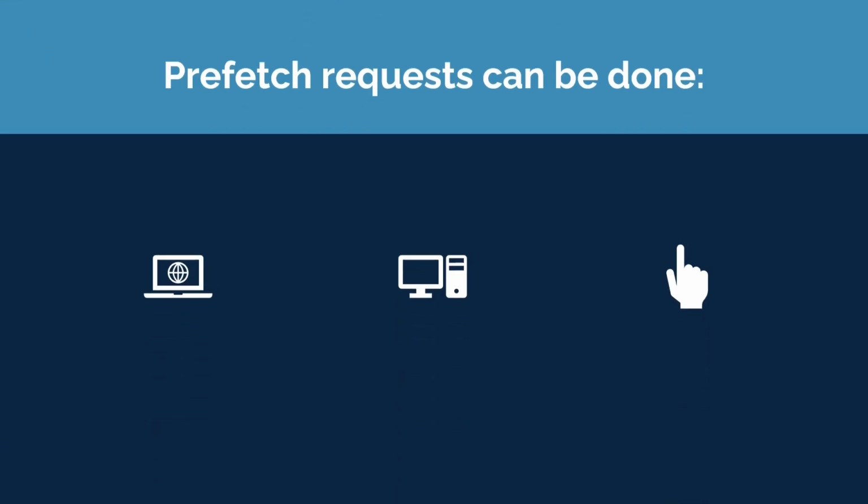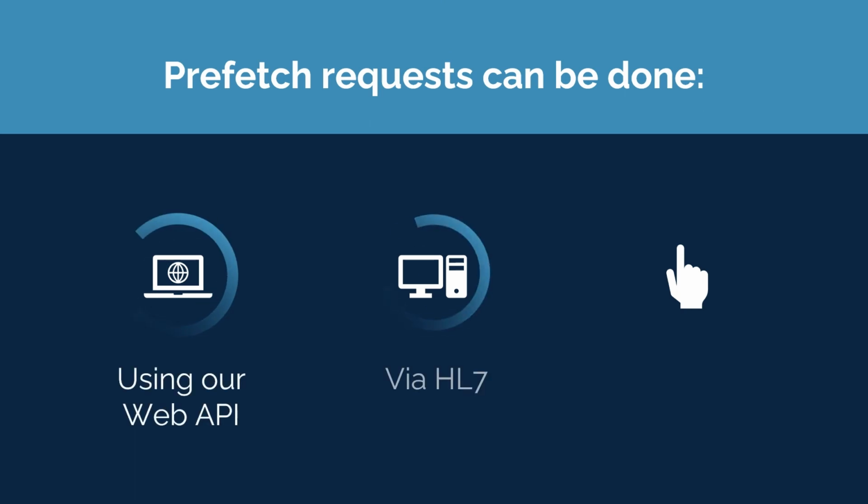Prefetch requests can be made using our web API, integrated by third-party applications, via HL7 by information systems complying with this protocol, or manually through the web or desktop application.